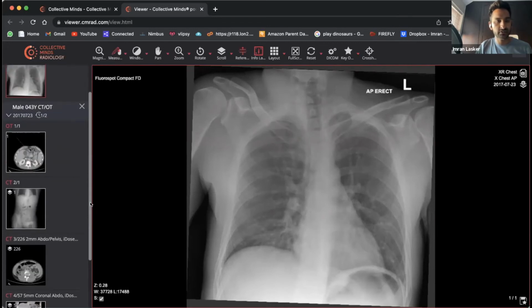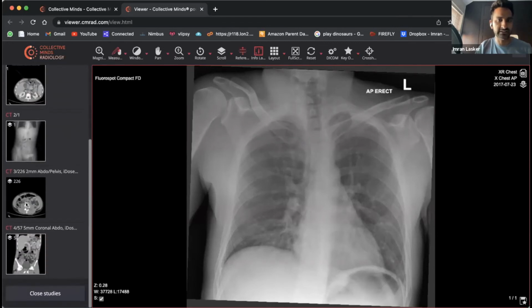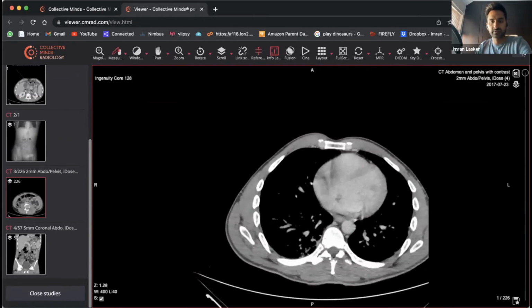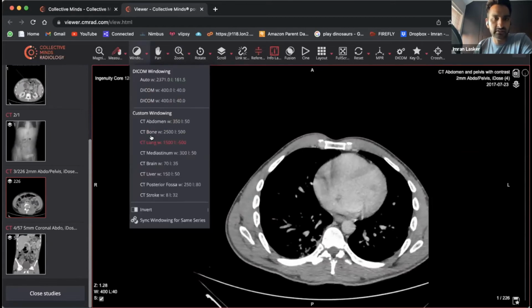But the patients come in with abdominal pain, and they've come in and got a CT scan. So let's go from the very, very top. Okay, so we can see a little bit of gunk within that lung area there. So let's have a look and see what's going on.